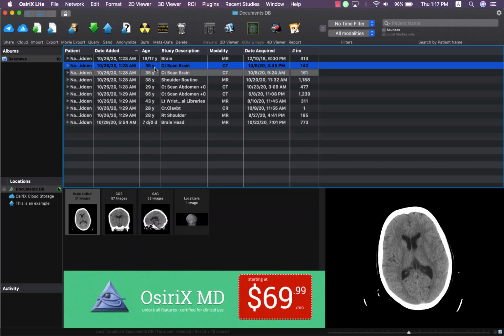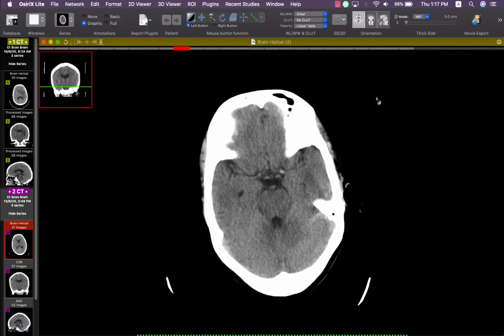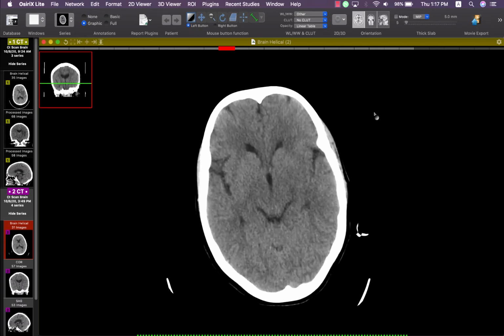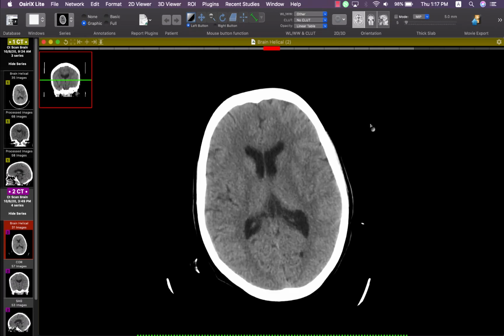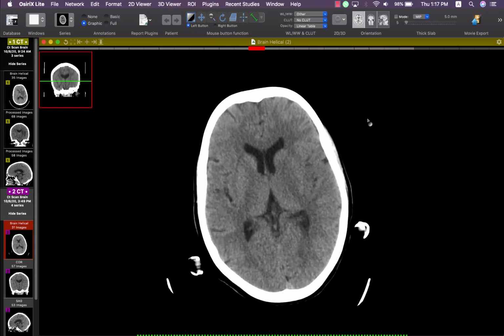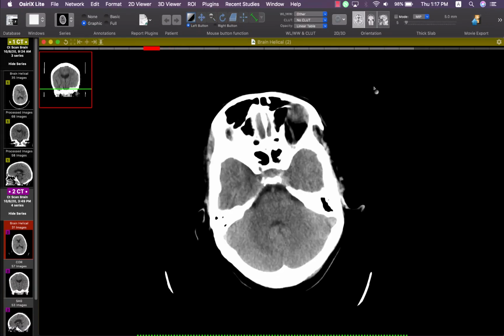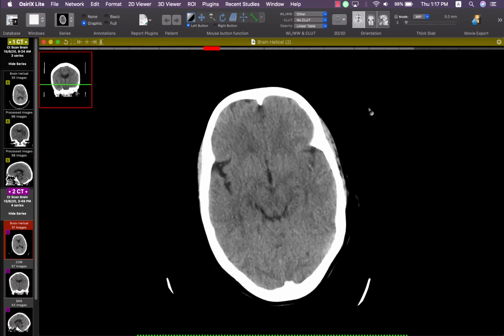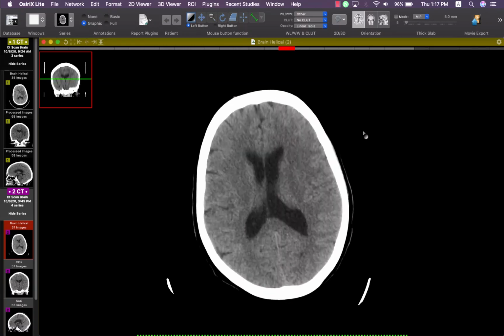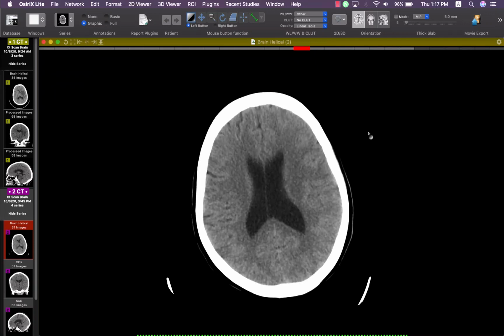Okay, this is a 35 year old patient who came to the emergency with signs of acute ischemia in the form of acute dysarthria and acute right-sided hemiparesis. In this case, it is important to search for the signs of acute ischemia in the CT brain when you are facing such a case.